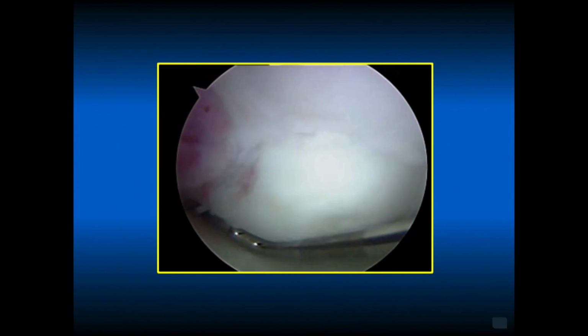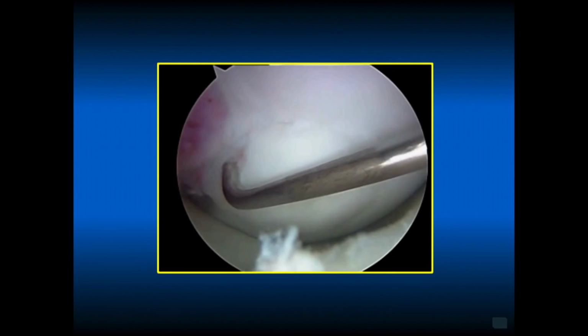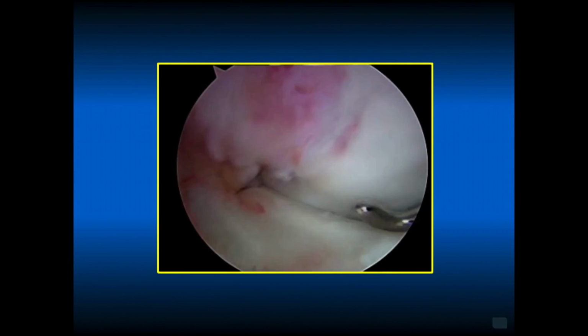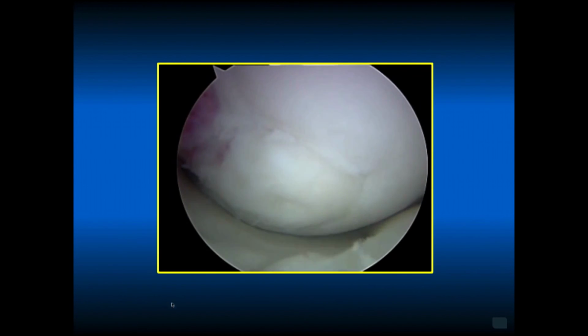The lesion looks excellent with the position of it and the stability of it. And you can see where the tibial eminence may be a contributing factor to this based on this compressing this area that is an area of more soft articular cartilage and bone and repetitive trauma.